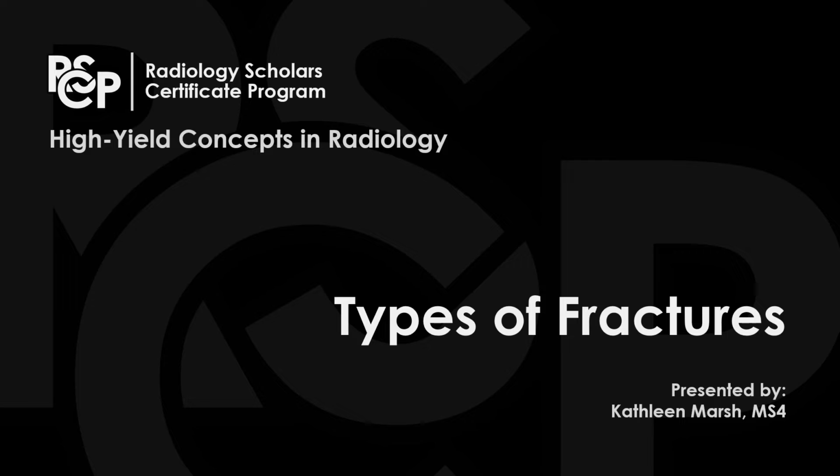Hi, my name is Kathleen, and in this presentation I will be discussing different types of fractures we see on X-ray.